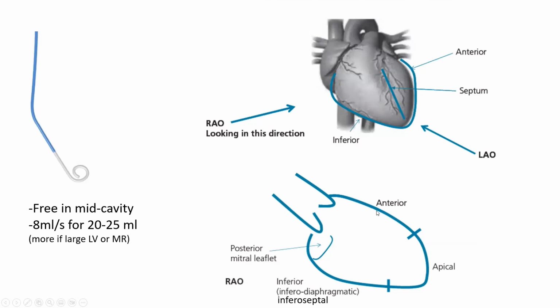It shows you the long axis of the LV and separates the anterior wall, apex, and inferoseptal wall, the wall that is sitting on the diaphragm. That's the inferoseptal wall, which is where the PDA runs. Now, it's 2D imaging. We don't see the posterolateral and inferolateral portion of the LV. We don't see that part here on the left margin of the heart.